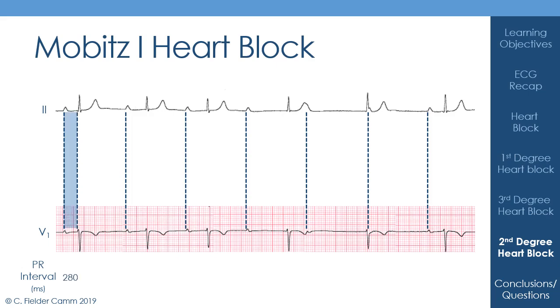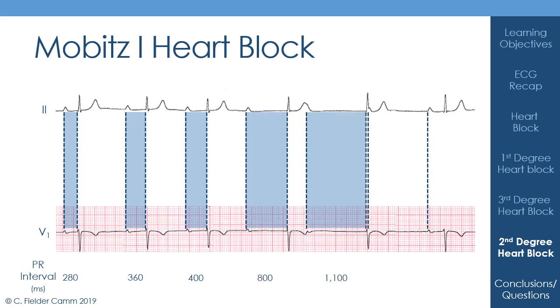So we've got our first one here on the left-hand side, and that's at about 280 milliseconds. So it's already slightly prolonged. It gets a bit longer. Now it's up to 400, 800. This one's conducting very far along, so that's taking slightly over a second to get there.